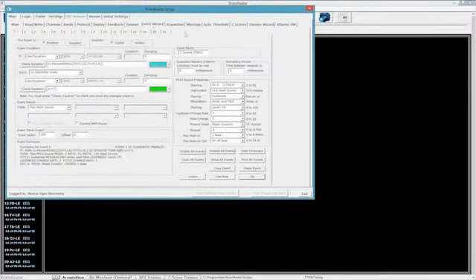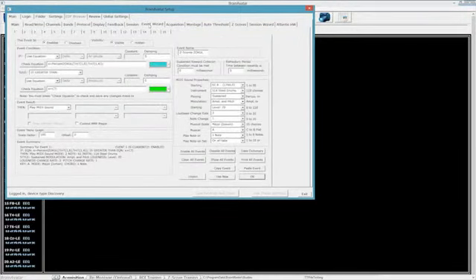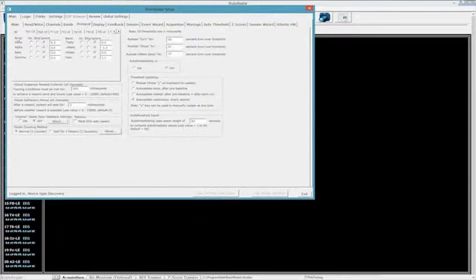The Event Wizard, to look at it the easiest way, is just a little bit more complex version of this right here. Let me break it down for you. You have 16 different possible events that you can have in any one settings protocol. In order for that event to be working, you have to enable the event, in this first box right here where it says this event is. You don't have to worry about making it visible or anything like that. That was more of a feature in prior releases and will be disappearing in a little bit. The event condition is basically this right here.